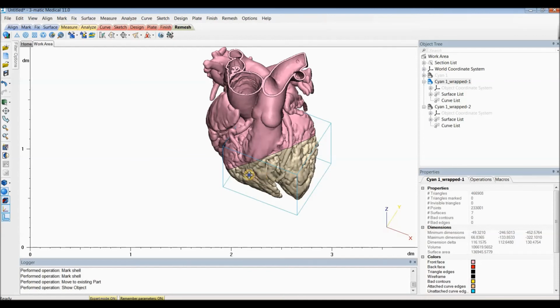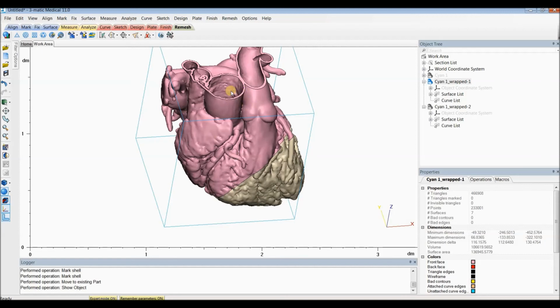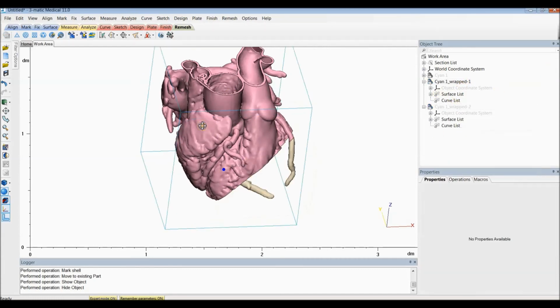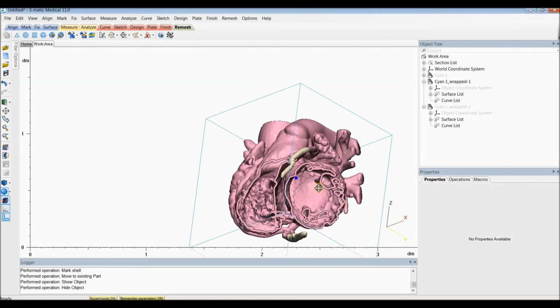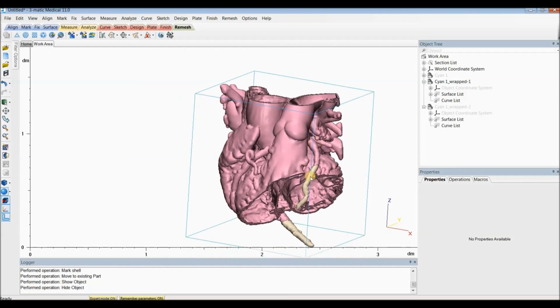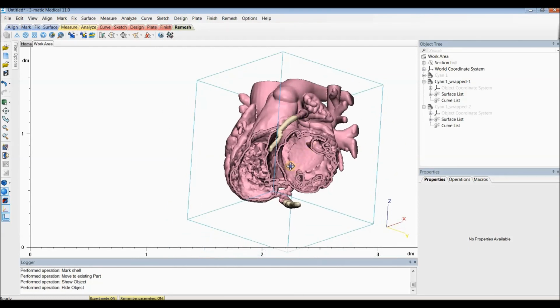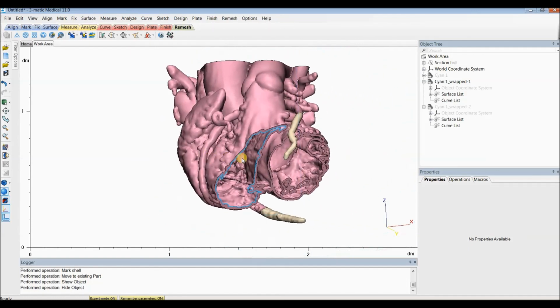And so when cutting your part, you also want to keep in mind what sort of printing technology you'll use and what sort of support material or where the support material will be laid. Because you want to make sure, especially with these hollowed parts, that you're going to be able to access all the areas where support material will be placed, and so you can remove that support material very easily. And you might have to make a few additional cuts just to be able to clean out all of the support material once it's printed.